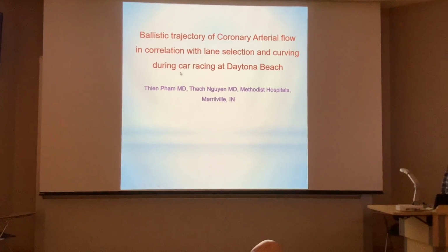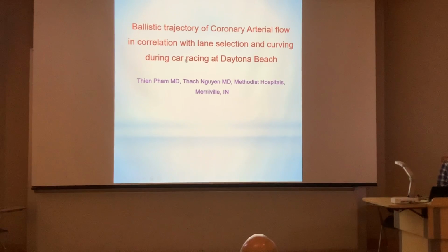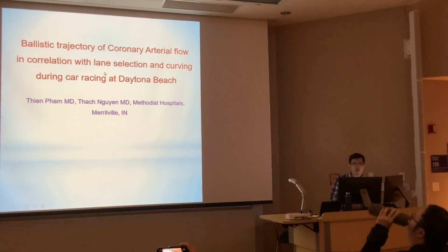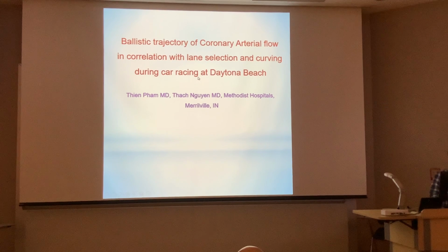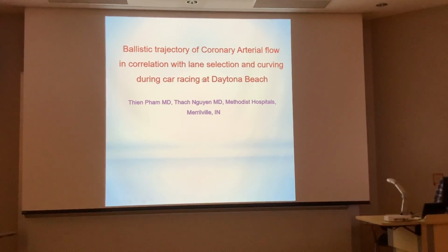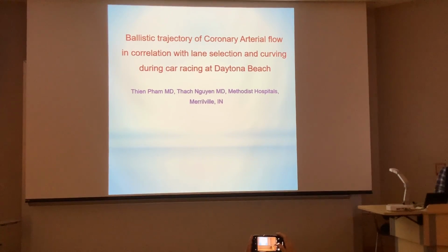So continuing with the very new techniques we use for the angiogram, I have two very interesting images that we recorded with this new technique. The first is the ballistic trajectory of the coronary artery flow in correlation with the lane selection and the curving during car racing at Daytona Beach.